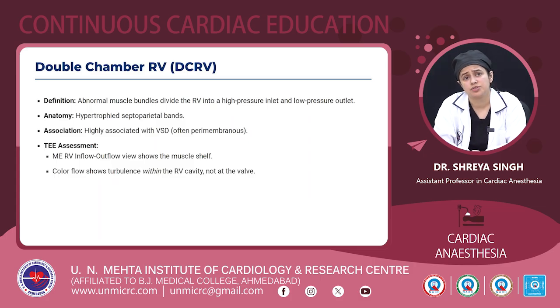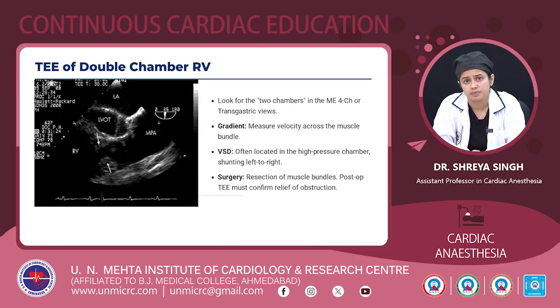Then we have double chamber right ventricle, that is DCRV. So there are abnormal muscle bundles which divide the right ventricle into a high pressure inlet and a low pressure outlet. So these are hypertrophied septoparietal bands. They are highly associated with VSDs, often perimembranous. And on TEE, we can see it in the mid-esophageal RV inflow-outflow view. It shows the muscle shelf, and color flow shows turbulence within the RV cavity, not at the valvular level.